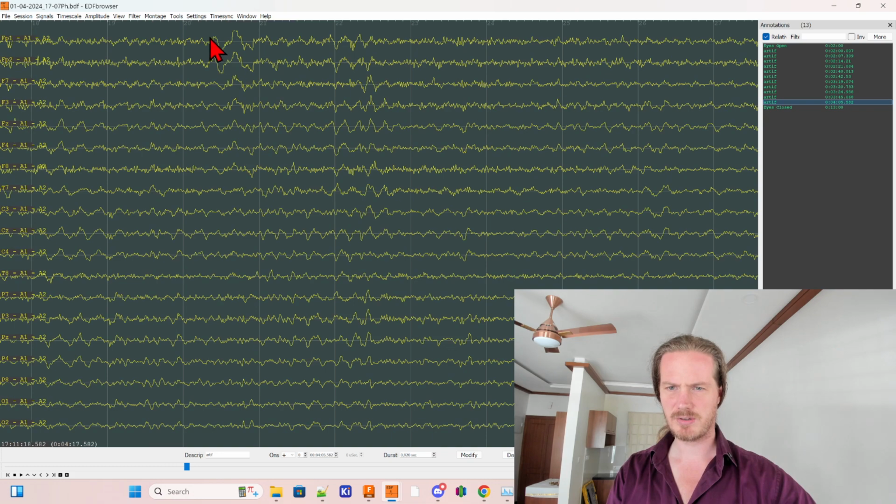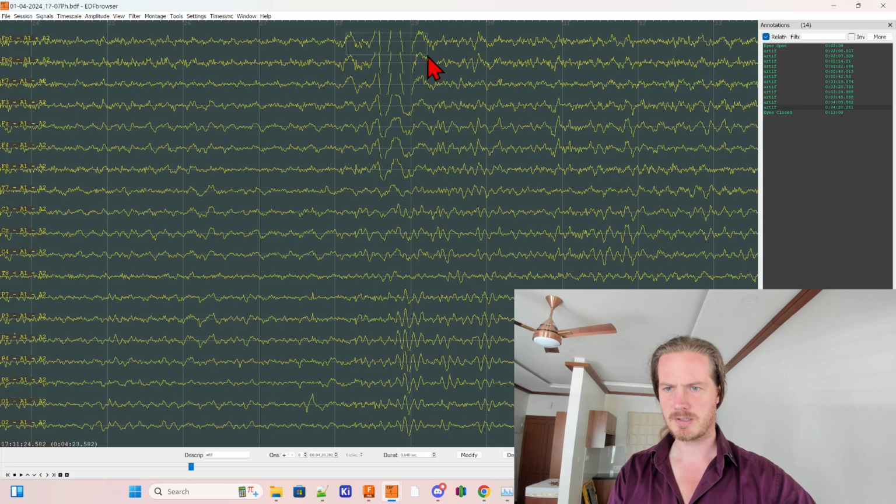This is a minor little thing. You know what? I'm just going to mark it. And I'm going to mark this period.